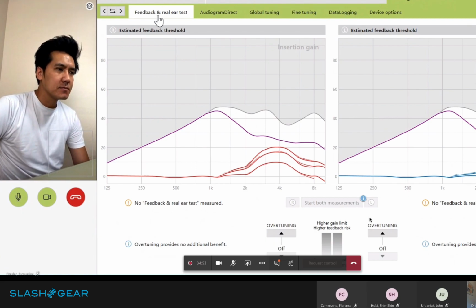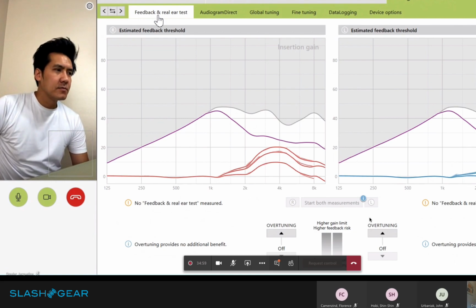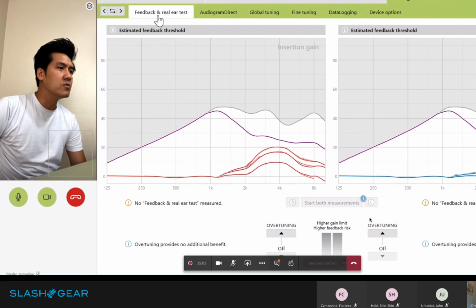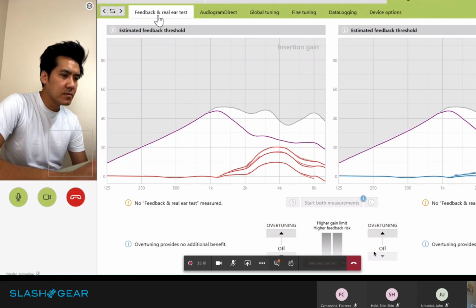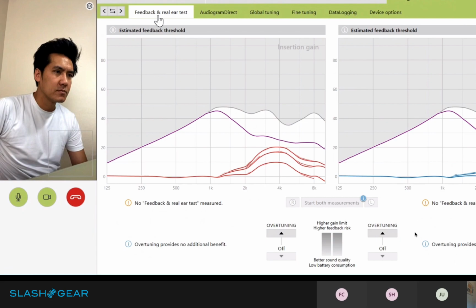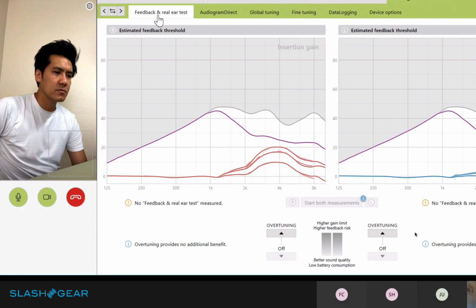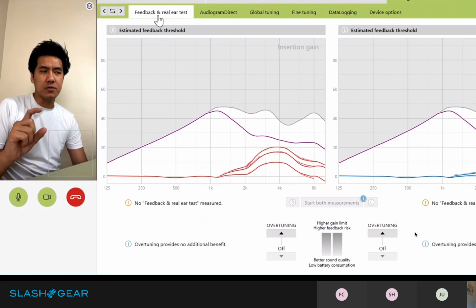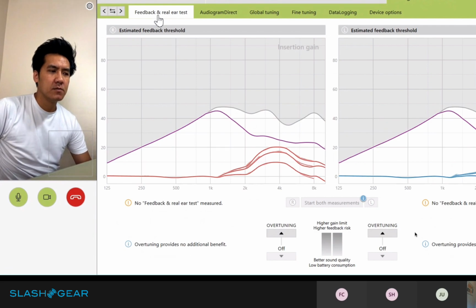Okay, so I just moved to the screen here, and for feedback like this, we have this feedback management system. So I have an idea of what could be causing this. Very cool. And typically, what is ideal when you're having a hearing aid fitting is you have a feedback test. The feedback test is just to really configure the hearing aid appropriately so you're not getting these artifacts. Are you able to check or test or set that up remotely, the feedback test? So I can't actually perform the actual measurement because it has to be done in the clinic.